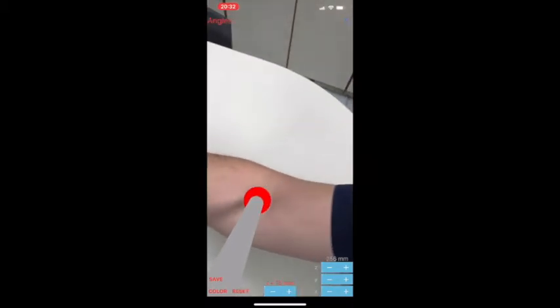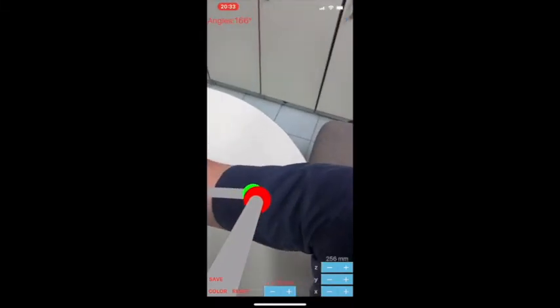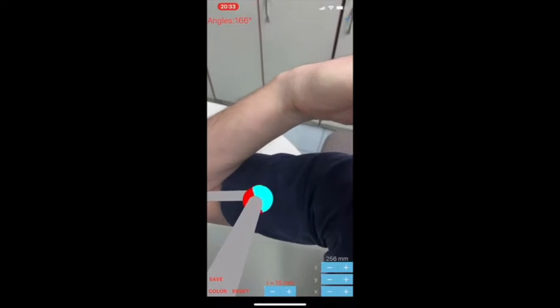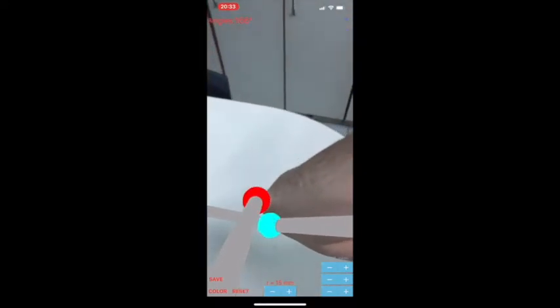the screen is touched. The positional calibration of the pointer tip sphere in AR can be easily done by allowing the user to adjust the Z position of the pointer tip sphere by pressing the direction buttons accordingly. This feature enhances the accuracy of sphere placement during measurement over joints in augmented reality, AR.